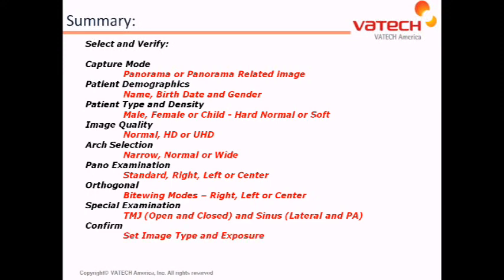Selecting confirm, which will then set the image type and exposure. Lastly, selecting ready to set the device and capture position.